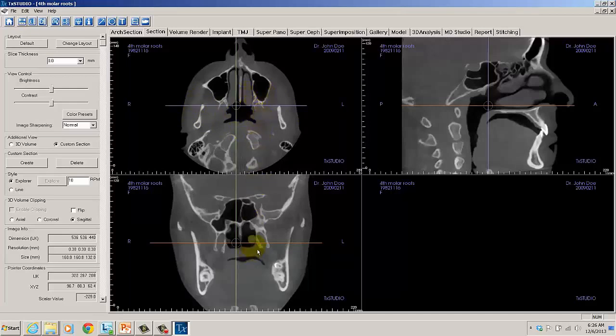Below the axial view, we have the coronal view of the patient. This is one thin slice, and we are looking anterior to posterior, and again we see the right side marked and the left side marked to the patient. The third view, which is the sagittal view or the lateral view, is a thin slice looking from the patient's right to the left, and we can see that we have the screen marked as P for posterior, A for anterior.